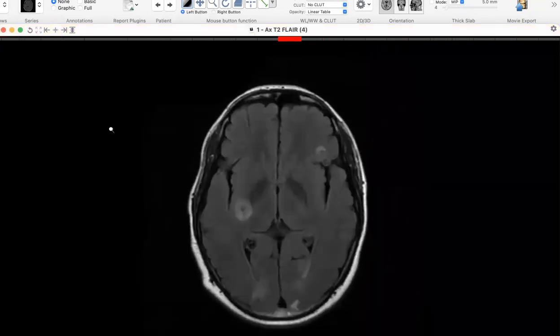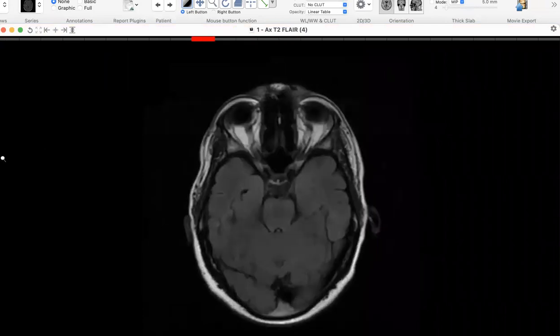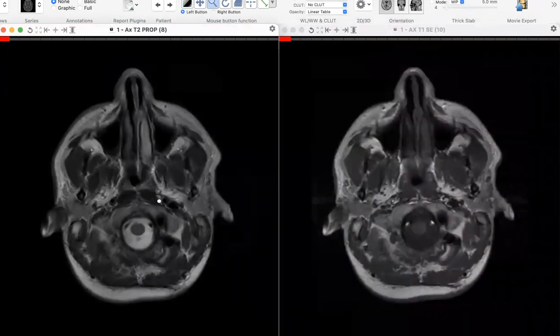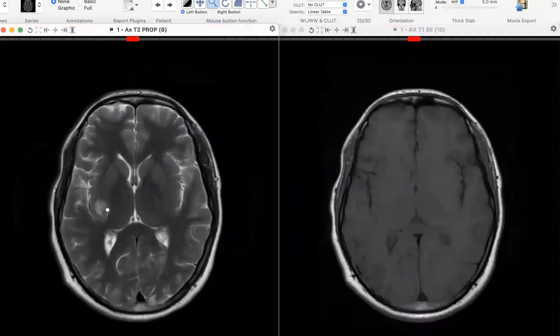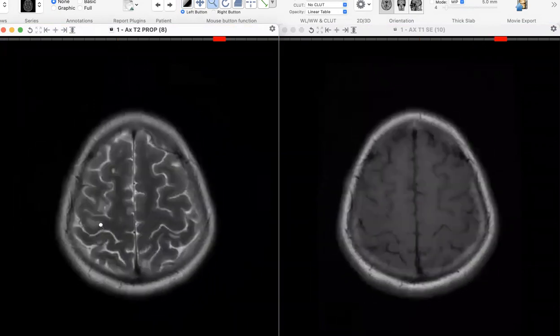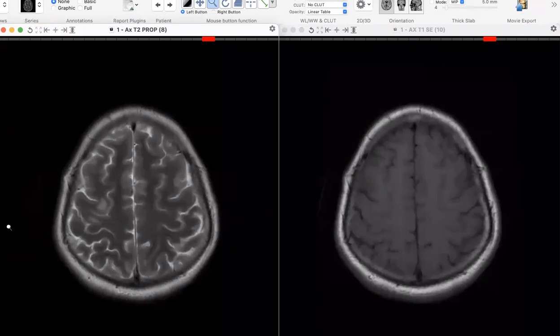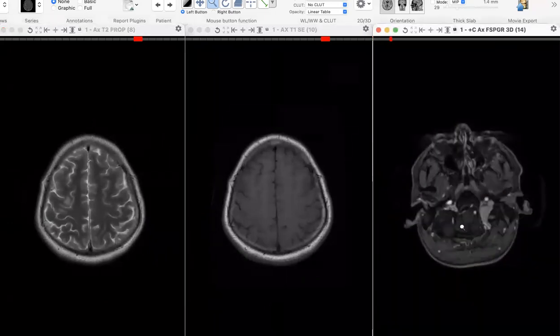So you started off, I think, with FLAIR, right? Or was it T2? T1 and T2, right? No, it was T1 and T2. So when you started off, you said there is hyperintensity. Scattered hyperintensity, right? So what does this hyperintensity represent? Is edema. And then when you were describing the post-contrast images, you said there's no associated edema or mass effect. So I just negated my own finding.